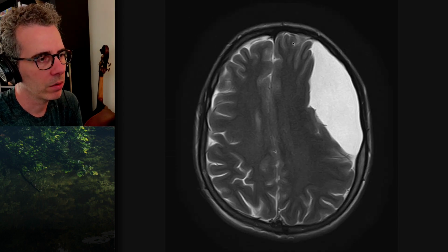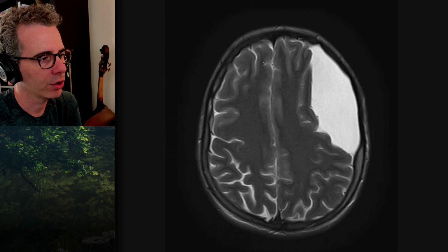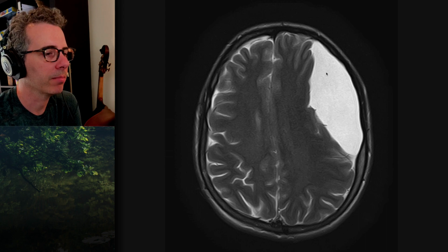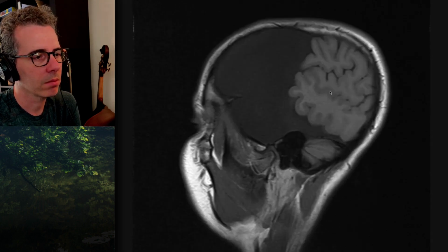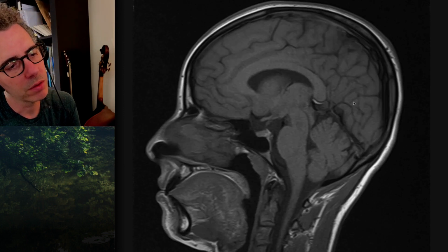So note here how all of these gyri, you can count these two gyri here are these two here, right? Or maybe even these two, probably these two. They're all sort of compressed. You can still see the normal anatomy that's being pushed, rather than in porencephaly where there's brain missing. Good. Now there's one more finding which is incidental and might not even be real.